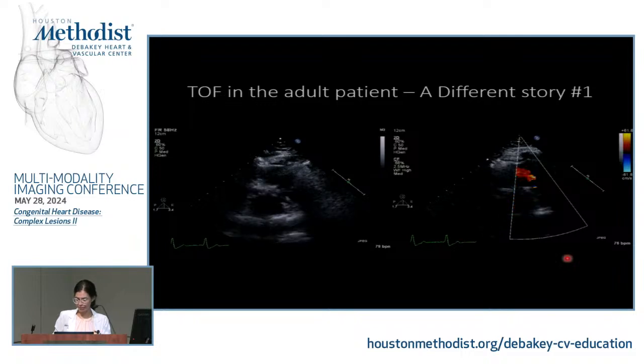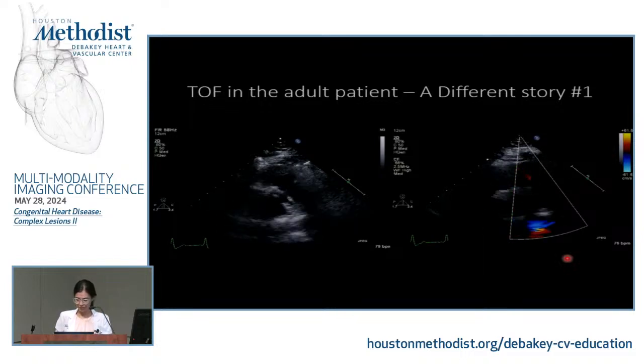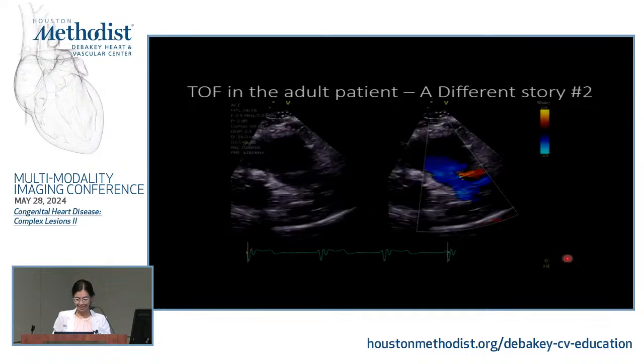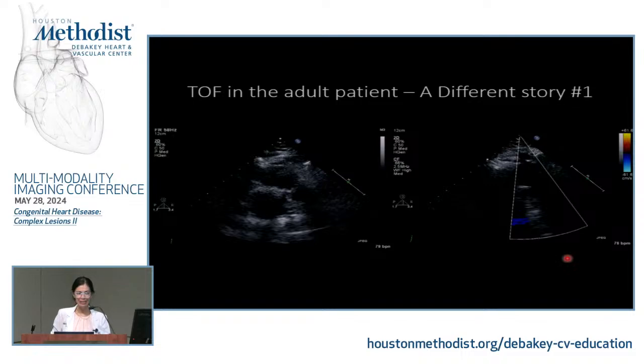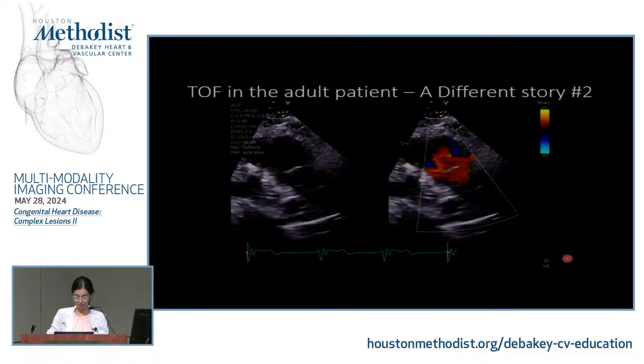Okay, so what do you guys think about the pulmonary valve here? Yeah, so that was another one. That one is looking pretty good. So let's look at another case.